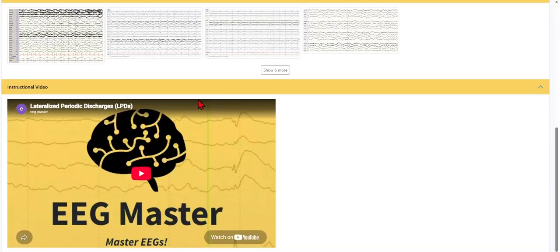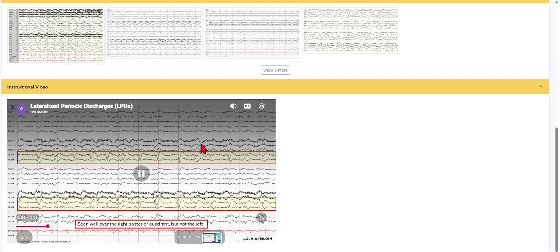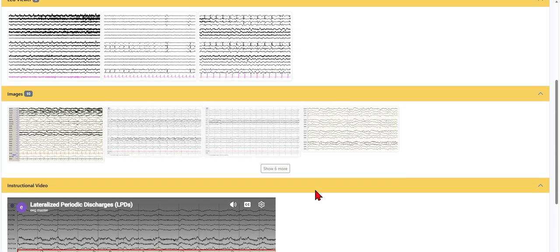And then finally, we also have a growing database of instructional videos. These are all really brief videos that last about 30 seconds that explain the findings as well. This is an example of lateralized periodic discharges, or LPDs, per ACNS 2021 IC. These are all created and curated by EEG or epilepsy neurophysiology faculty, and again, explain the findings that are depicted.